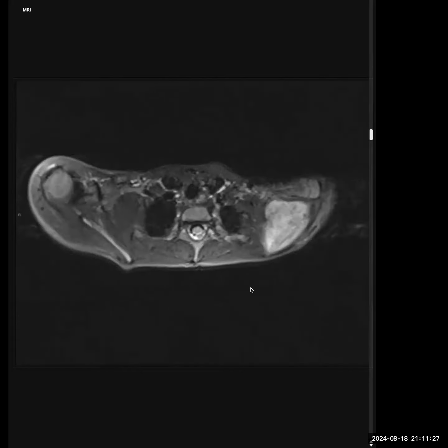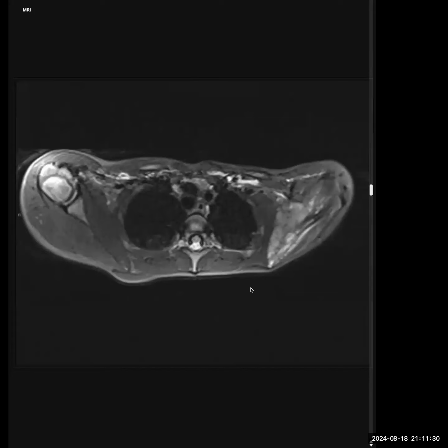So this confirms that this is an aggressive lesion for which this operation was done. I will convey these findings to the subsequent clinician. This patient needs follow-up in the subsequent sittings. Okay, you can take a look at the next case.